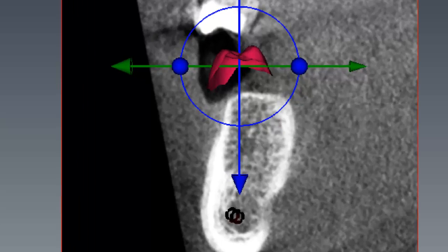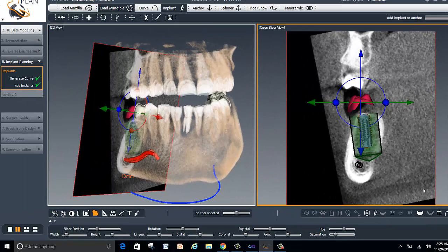And if I were to go ahead and show you how that happens, the software will calculate the safety zone around the load vector that's in there and will try to load the implant based on the position of the opposing cusp, the central groove, and the whole thing.